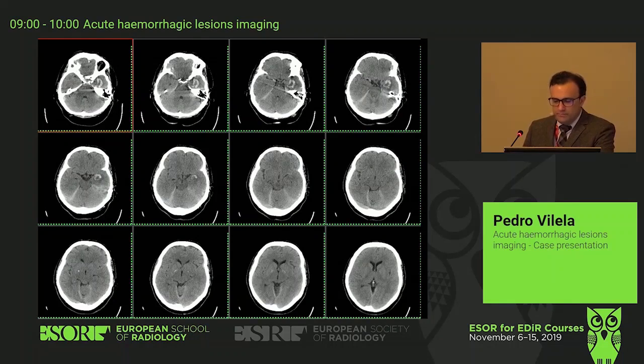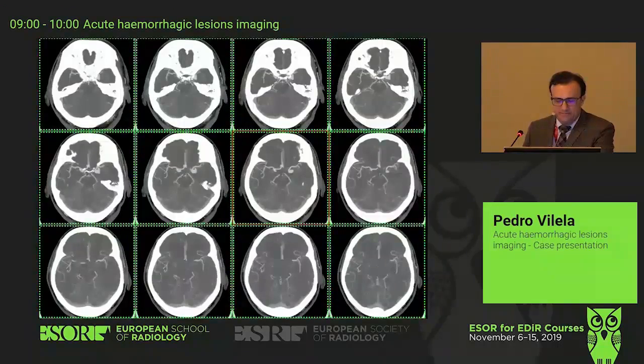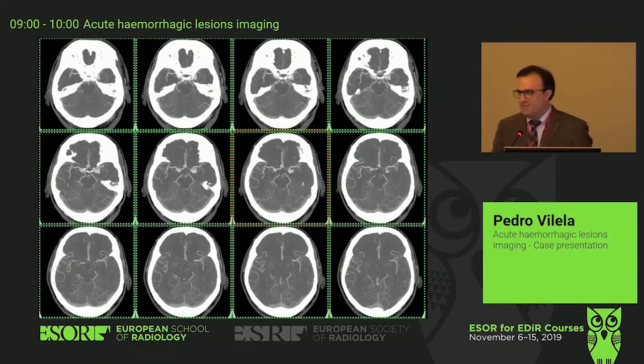So, what do we do now? CTA. Good. So you have the CTA. Where is it? Can you point it out?